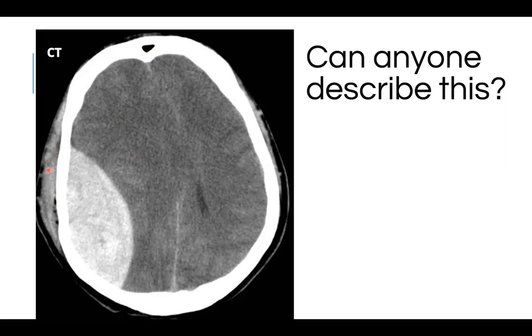Okay, good. Yes, there is some scalp hematoma on the outside, but how do we do this systematically? What would we start with? We'd want to confirm the patient's name, date of birth, that you have good details of the patient, and get a bit of background history. So for example, this patient was found on the road and possibly assaulted. So a CT brain was done.